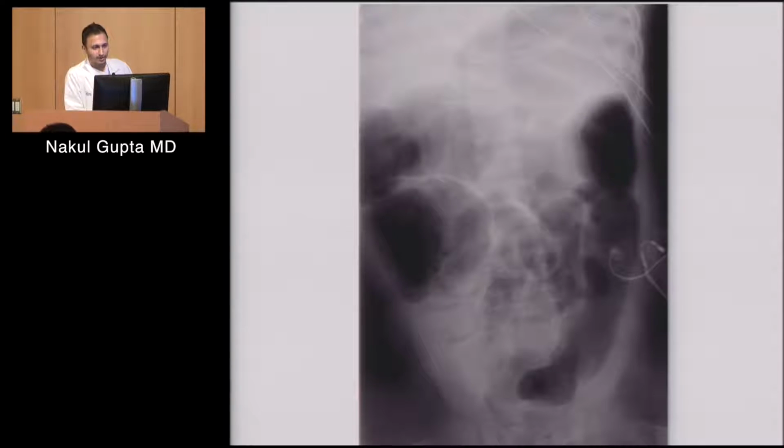So let's say this is a critically ill baby in the NICU. One thing they're always looking for is NEC, or necrotizing enterocolitis, and one of the plain film findings is pneumatosis, or gas within the wall of the bowel, and that's what you're seeing here in this right lower quadrant. You see this sort of mottled appearance, and all along this wall here, you have air within the bowel wall itself. You can kind of get that feeling as you look at it for a second. This is pneumatosis.